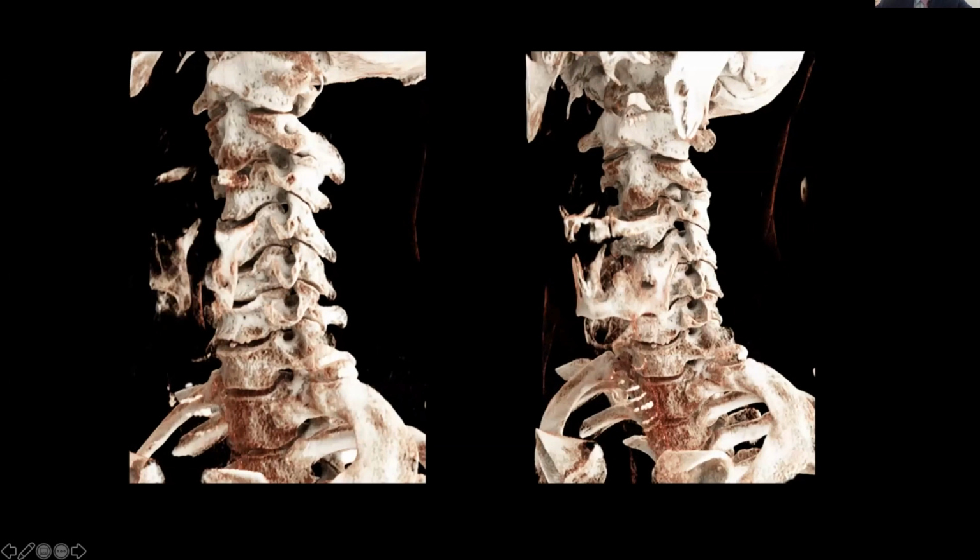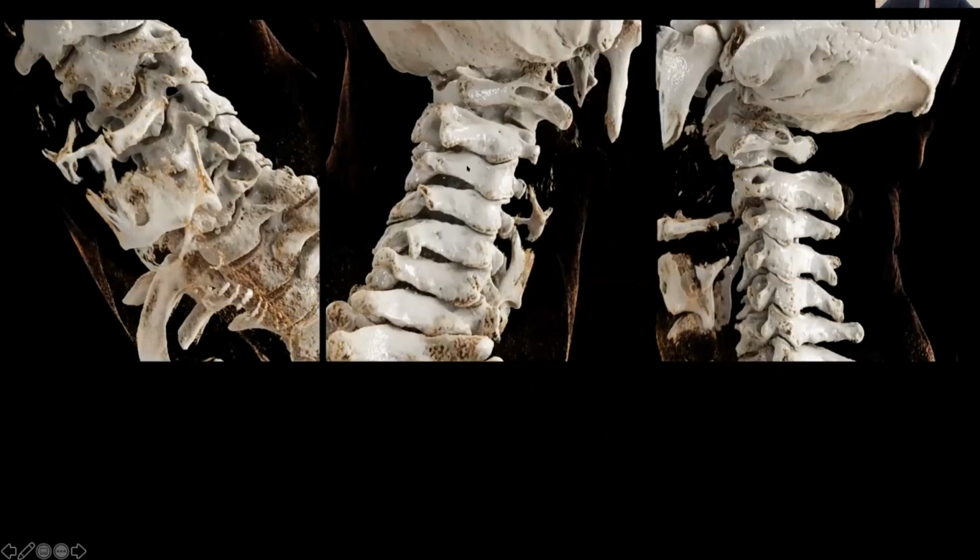You can see that it's actually a nice little tunnel that can lobulate over time. Here is a different rendering, and on this one you can see the granularity of the bone surface, which for operative planning is quite helpful, to have a sense of where you could realistically place a screw, for example, and how that would relate to the facet joints.